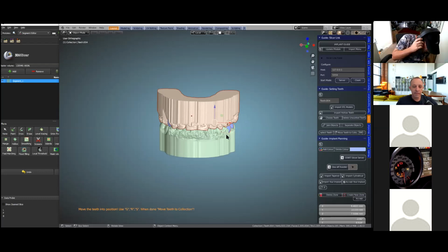No, it's just, well, with the implant planning, the question would be, do we have implant components, or do we just use virtual components for planning? Yeah, we've got two generic implants. And the other question is, can we swap to our own implant system? Those two questions, basically. So if we've got implants, yeah, we do have implants. I'm answering my own question.